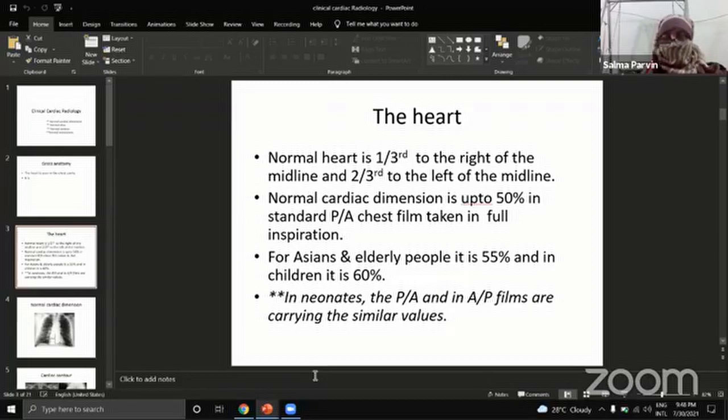Can you hear me? So you go through these hemidiaphragmatic levels, where there are so many causes that the hemidiaphragms remain higher than normal in the inspiratory phase, or there are situations where the patient really cannot make a good breath to push the hemidiaphragms down.